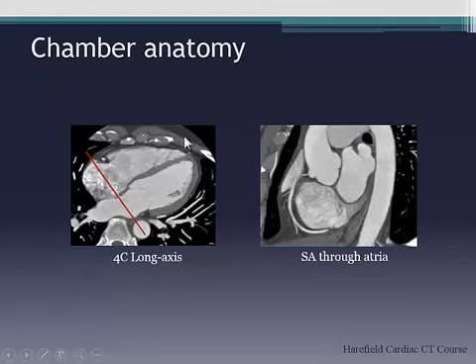heading north. As we head north, you get the interatrial septum. You can see the coronary sinus here coming through. And the reason why, obviously, it's not as opacified as the right atrium is because you've got a valve there. Do you know what the valve separating the coronary sinus from the right atrium is? No, Eustachian's IVC, isn't it? So Thebesian valve, right? Okay. So often it can sometimes be a little bit closer into the coronary sinus than you'd expect, but you often don't get contrast opacification refluxing because of that reason.